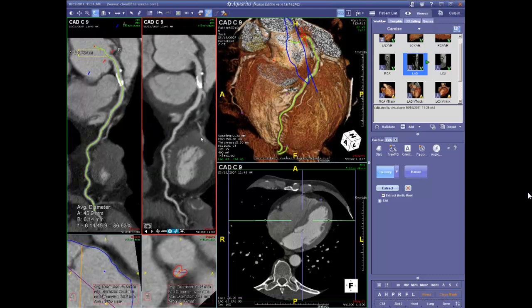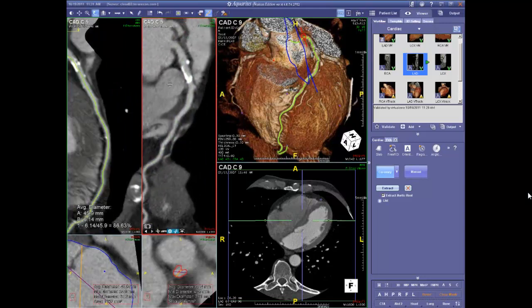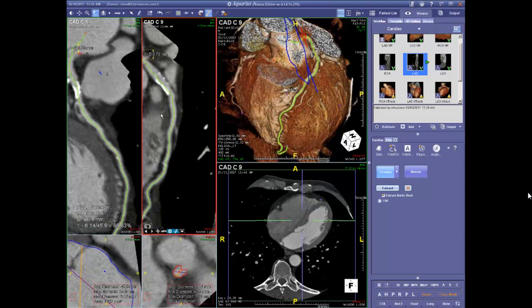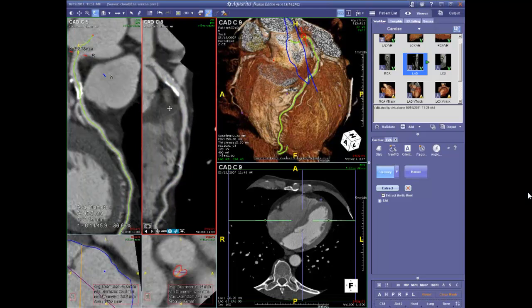And I'm going to go ahead and magnify this area up, point that out, and let me drag it a little bit more to the center and hopefully highlight that for you. We've got a nice center line drawn through here. Typically the computer will not help us that much if we don't have a good center line drawn. But we've got a nice area here.